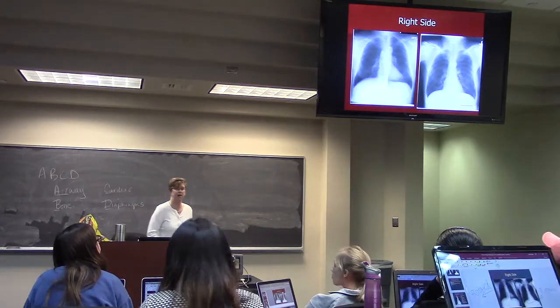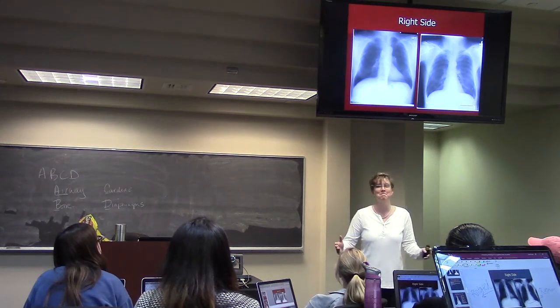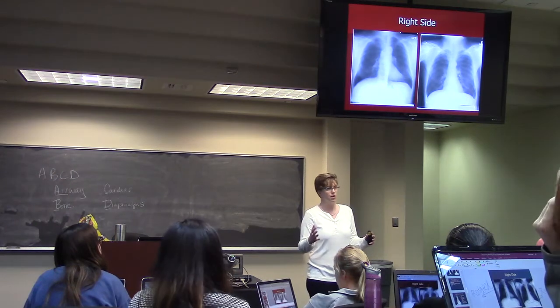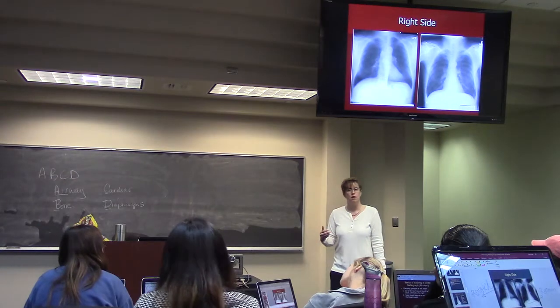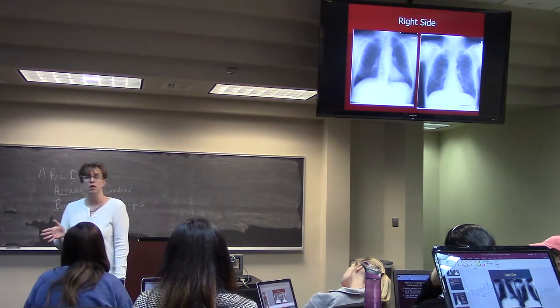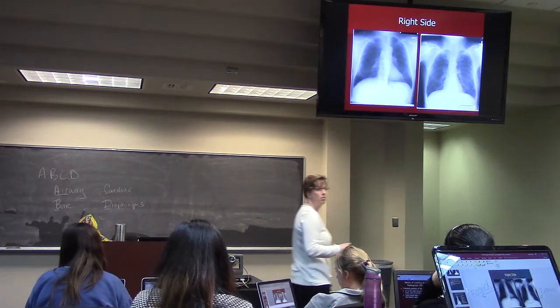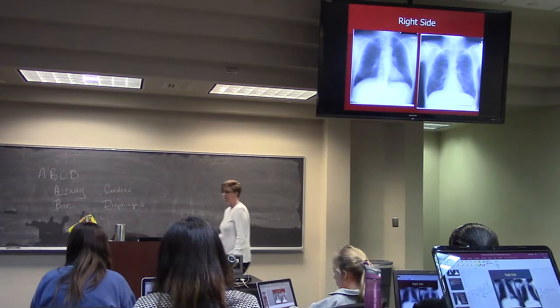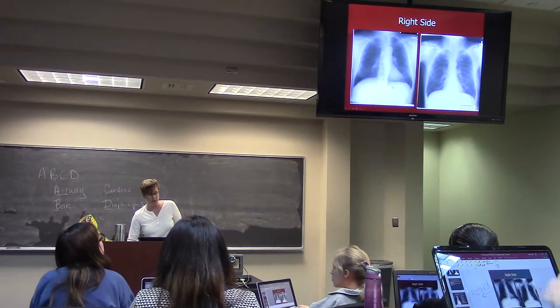How do I know what's the right side and the left side? It's marked. That'll help you. Okay, so if you put a heart x-ray up, make sure that you have the right and the left the right way. But people can have a heart that's flipped, right? So you can't always go by the heart, right? Look for the gastric air bubble. The gastric air bubble is always on the left. So your gastric air bubble, which is difficult here, but it's right in this area.